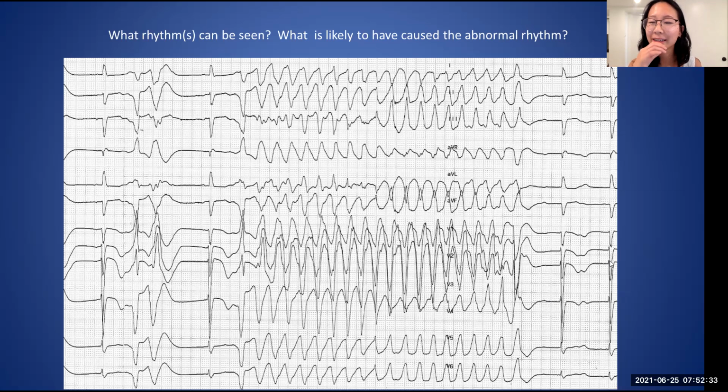Yeah, it's kind of hard to make out, isn't it? I think this is the P wave here. That's the P wave that we've got going on here. And this is an abnormal notched T wave that we've got going on here, with a very long, very prolonged T wave.